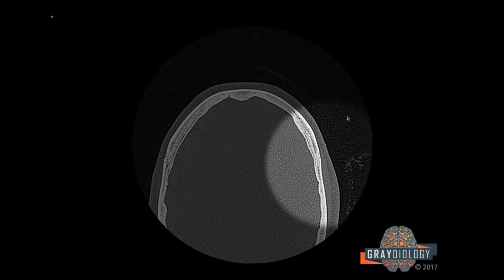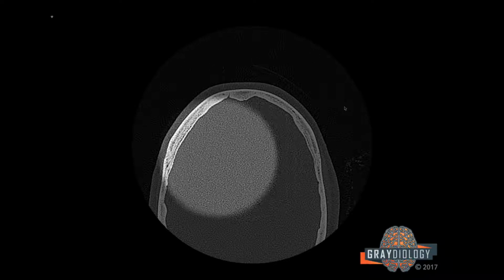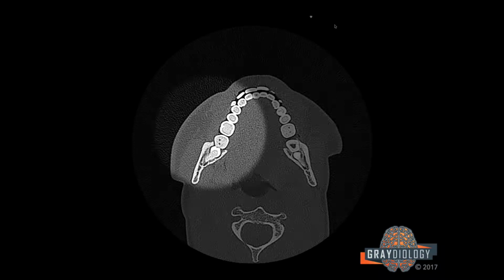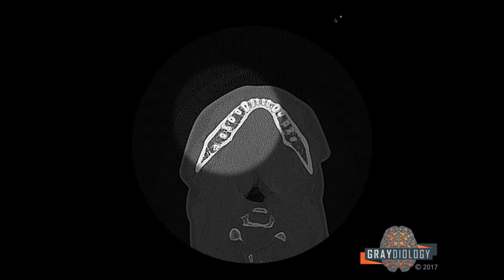Now on a face, oftentimes the back of the head is excluded, so I'm not going to assess that. Then I'll look at the right superficial soft tissues and I'll go down. So I'm rastering up and down. Okay, so I look through that and that seems fine.